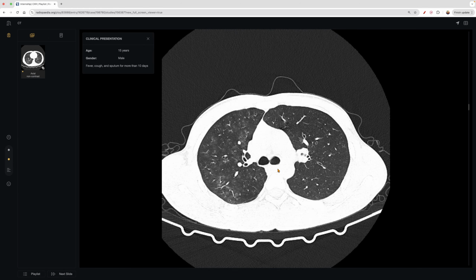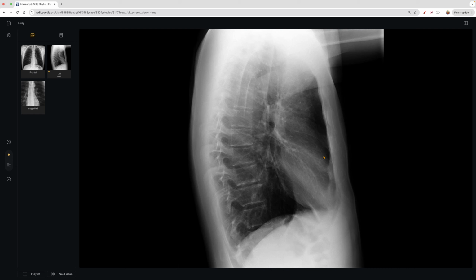You can see the normal appearance of the heart, right? In comparison to one that maybe has pathology, you'll see that there's actually increased opacification here. And then right behind the heart, the retrocardiac recess is also supposed to be dark. And so the key takeaway for a medical student is that this spine should be getting darker as you go down. If not, there's something going on, potentially pneumonia. And then same idea for the retrosternal and retrocardiac spaces here. There could be some kind of consolidation appearing.